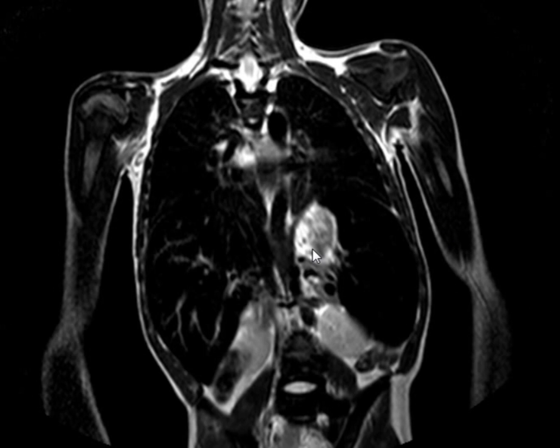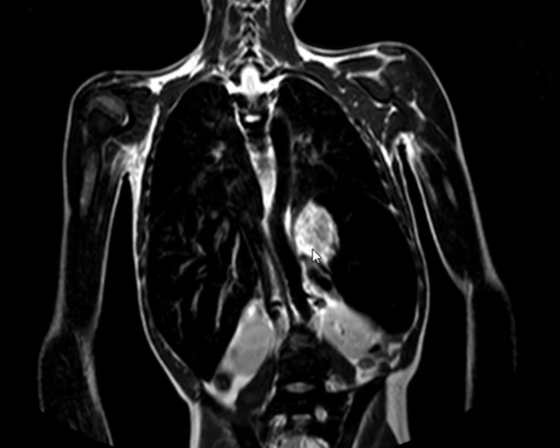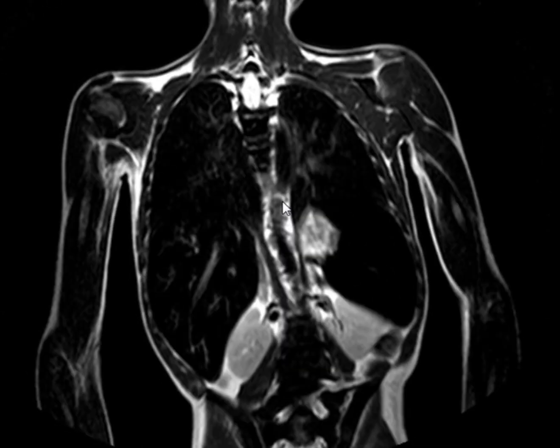So, your diagnosis? Hemolytic anemia, like a special anemia. Sickle cell. Does sickle cell cause splenomegaly? No. What does sickle cell cause? Autosplenectomy. You have loss of spleen. What kind of anemia causes splenomegaly? Thalassemia. Excellent.